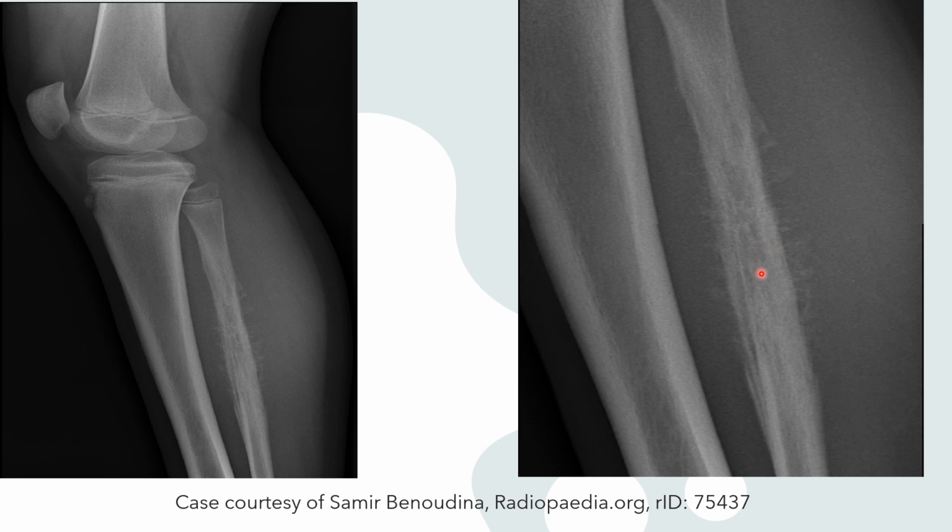Because of the growing tumor inside, the periosteum is proliferating really fast and aggressively. Also, you might notice that over here the periosteum is elevated and it forms a triangle. Now, given these three or four findings, as well as the age and demographic of our patient and the location, the diaphysis of this long bone, these are indicative of an Ewing sarcoma.